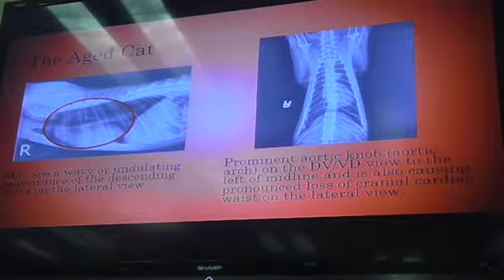You guys see it kind of coming out, and it looks almost as if you have one of those little light bulbs with a hook. Maybe. Yeah, I'm gonna point it out, because look, you gotta use your imagination. Monday, Wednesday, Friday at 10 o'clock, y'all gotta change your brain to an imaginoscope, and y'all gotta pretend to see these shapes in the clouds with me, okay?